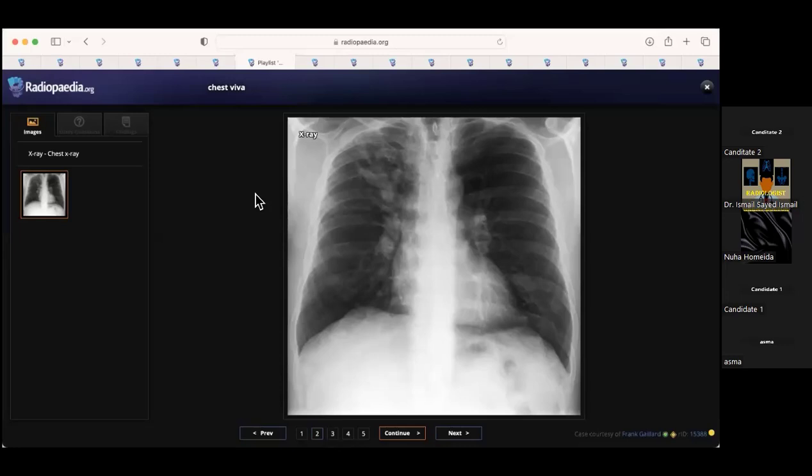So comparison with the previous images and correlation if the patient is known to have any chronic disease is the next step. Yes, well done. You've picked it up nicely. It is ABPA, a tubular finger and glove appearance involving the right upper zone. There is an important negative here that you need to mention, just to show the examiner that you're actively looking for it.